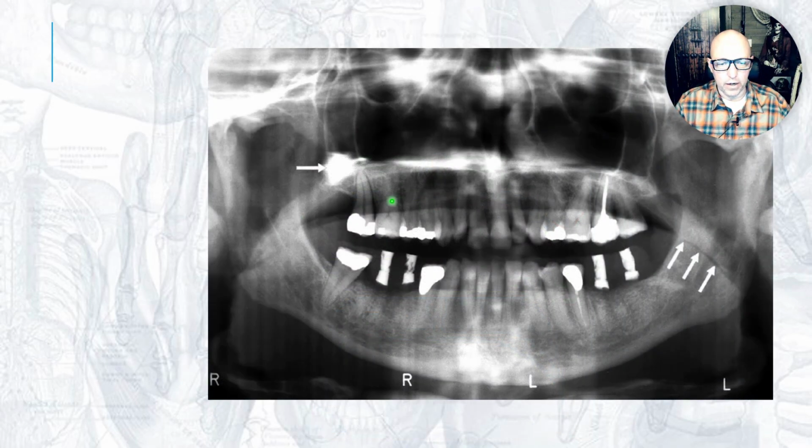All right, a couple arrows here. What are they pointing at? Is this some object in the sinus? Look at the sinus borders. It looks like it should come through here. Probably not a metallic object in the sinus. Why do I say metallic? Just for the sake of how radiopaque it is. That's something metallic. Does it have nice sharp borders, or does it look more like a ghost image? A little bit blurred. Can't really tell on this one, but a lot of times you'll see more of that horizontal stretching, the horizontal magnification, where it's more blurred horizontally.